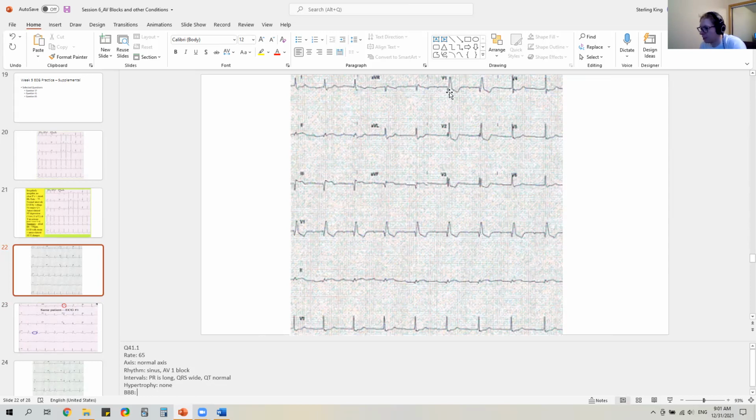And then let's do our bundle branch blocks. So it looks like a right bundle branch block with the M up there and the wide QRS. So just a right bundle branch block there. And then checking through our Qs, STs, Ts. So Q waves in lateral leads, none. So no Qs. STs. This could be a little bit, yeah, it looks depressed. So ST depression. And T wave. It looks like normal T waves.